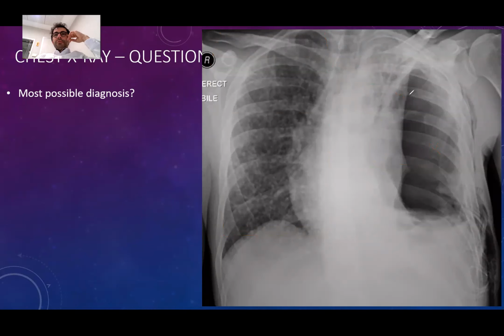So the lung has probably collapsed. This is the collapsed lung here, and this is the free fluid leveling. So we are seeing pleural effusion, subcutaneous emphysema on the left side, a big area of pneumothorax, and also interstitial nodular densities on the right lung. The heart is a good size. The airspace is open.